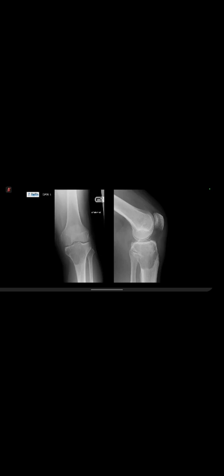Okay. What in particular are the features that you're citing for it being an aggressive lesion? An aggressive bony lesion usually has a wide zone of transition, a marked periosteal reaction, and a soft tissue mass or swelling.